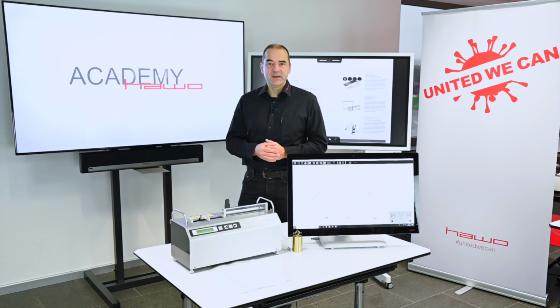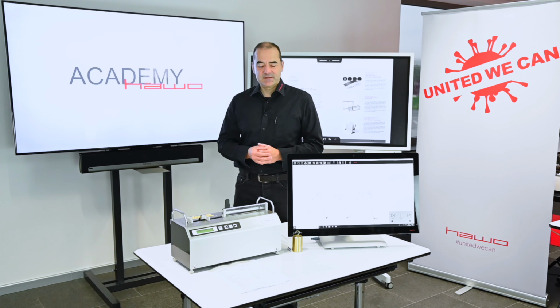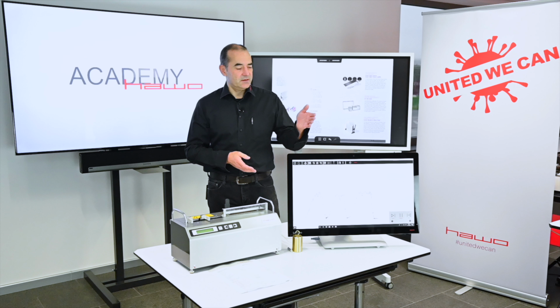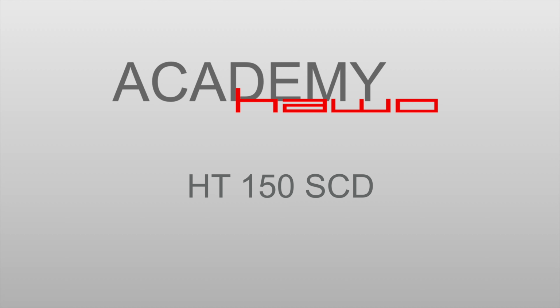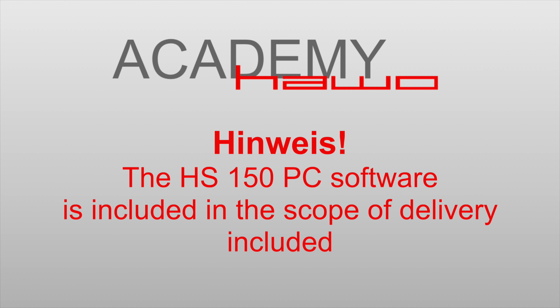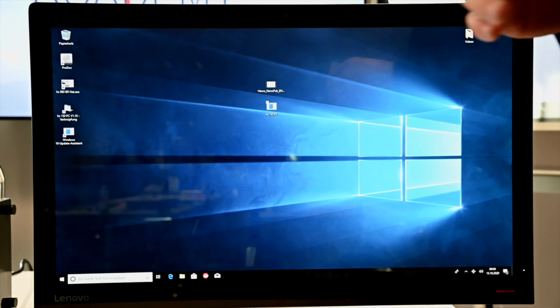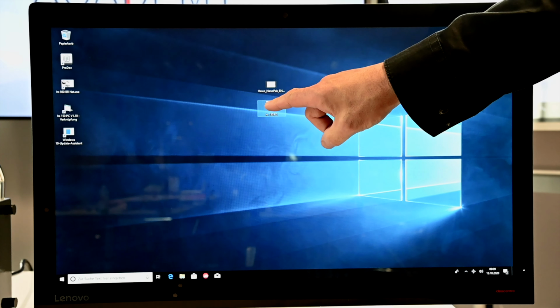My name is Dirk Finkenrath, and in today's tutorial I would like to present to you our testing system HT150 SCD, including its software HS150 PC. In order to start the installed software, please choose the related link.